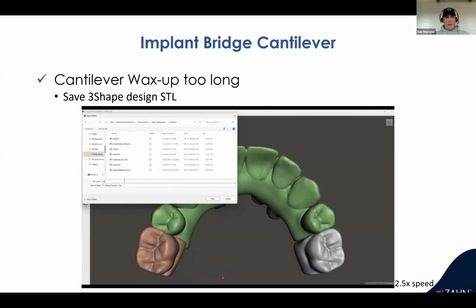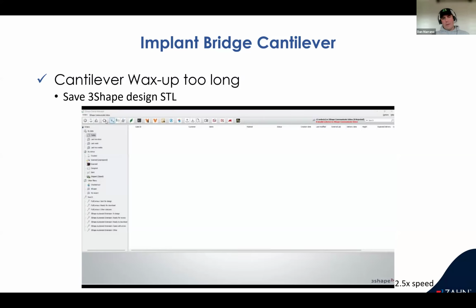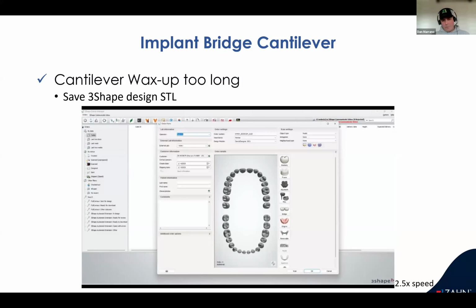And now we have a 1-piece wax up again that we can take back out of 3Shape to exocad to Mesh Mixer, and however you choose to go back to finish it at this point, we're going to finish it here back in 3Shape, the wax up tool, wax up copy.